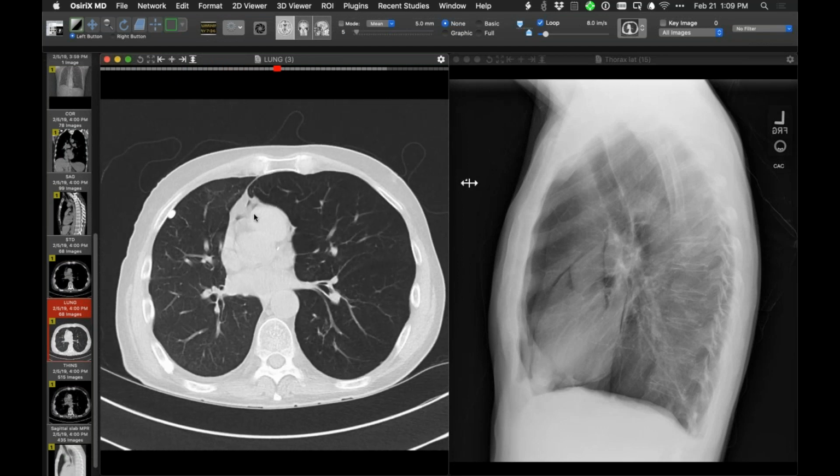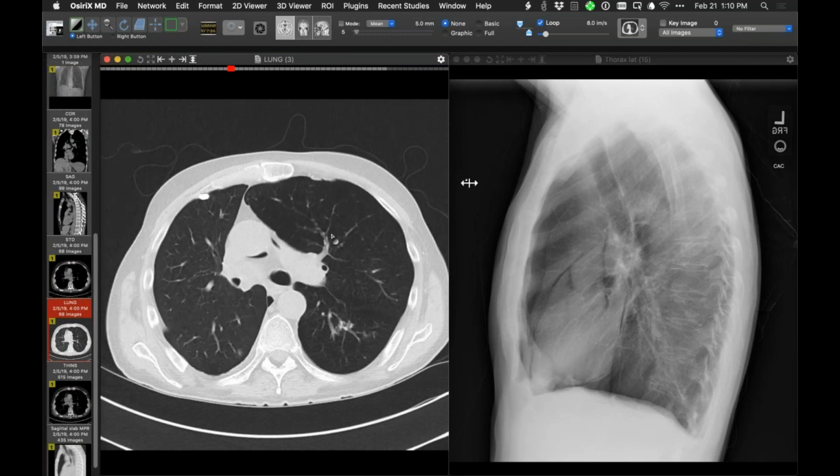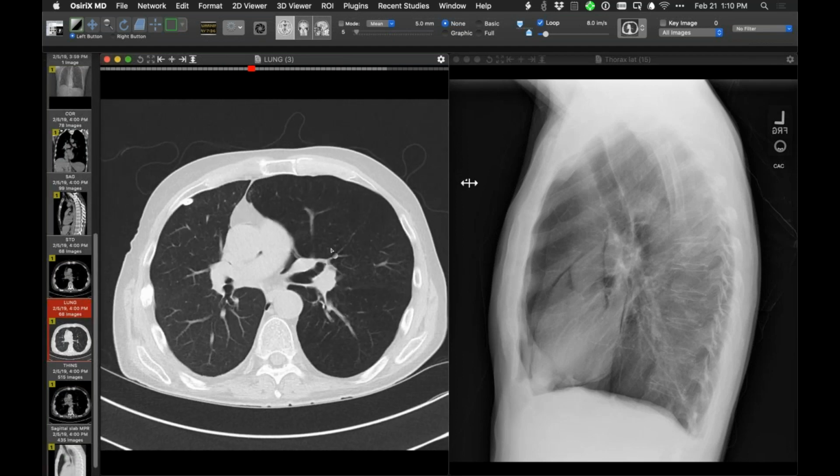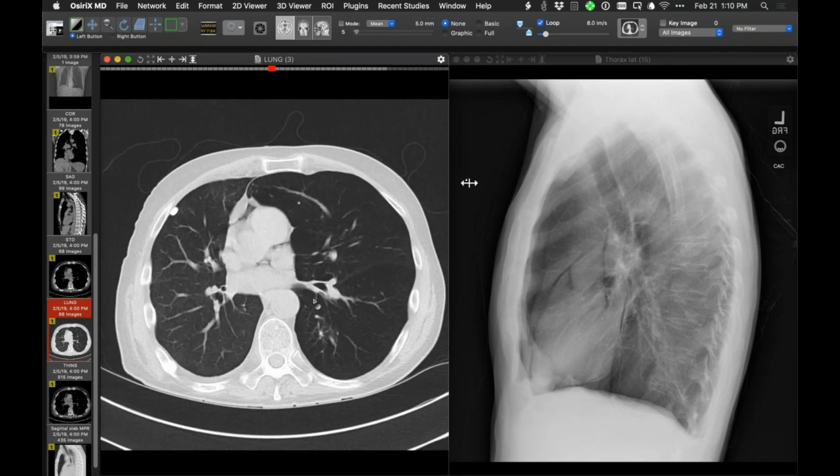So what about up here? Yeah, maybe most of it, if not all of it, actually could be in the pericardial recesses. Looking at it there and how peripheral it is, that's a really good thought. What about the right pulmonary artery? Well, maybe there's less air on the CT overnight. Yeah, it's a really good thought. I like that, actually.